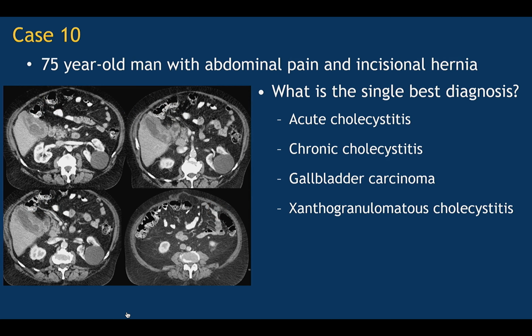What is the best single diagnosis to tie all of these findings together? Acute versus chronic cholecystitis, gallbladder carcinoma, or xanthogranulomatous cholecystitis? The best answer here is gallbladder carcinoma.